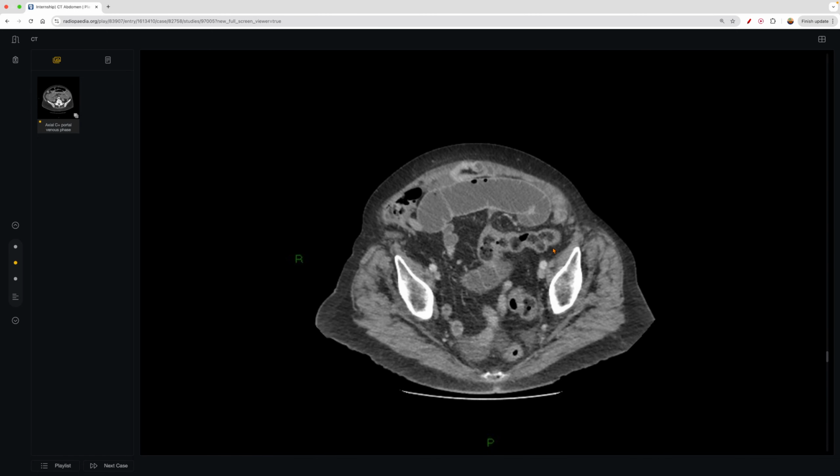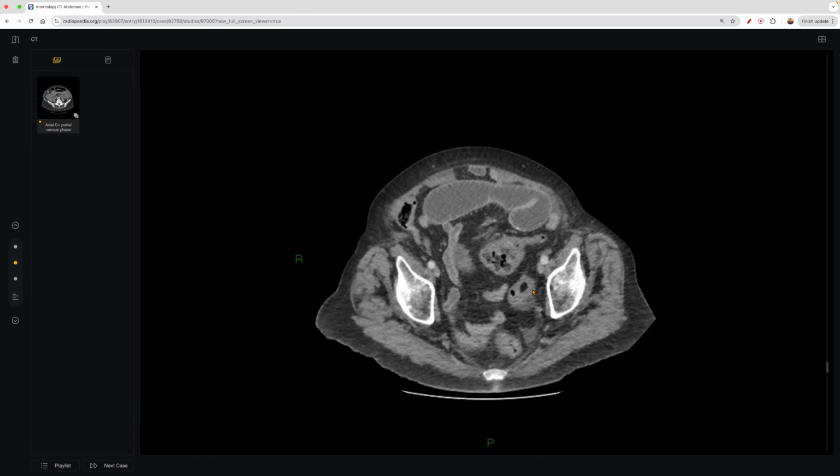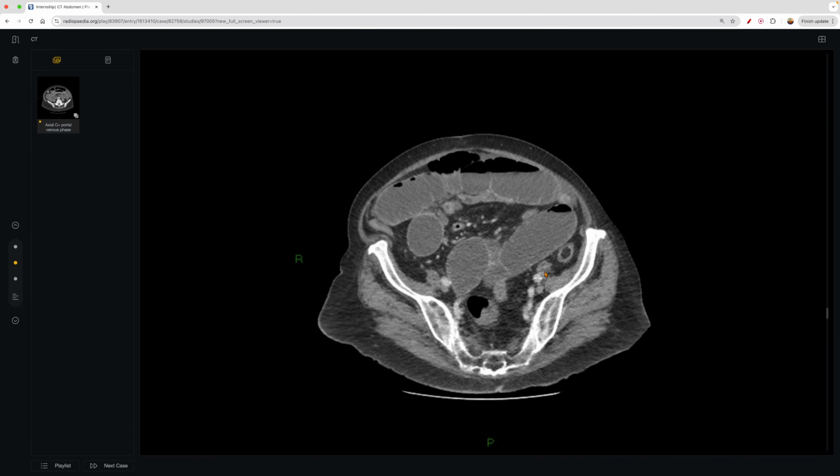And you can tell it's very, very minimal in its caliber compared to how it normally is. And that's because of the idea it's, quote unquote, artificially deflated just because there's nothing going through it. And so that's an important clue again for that disease.